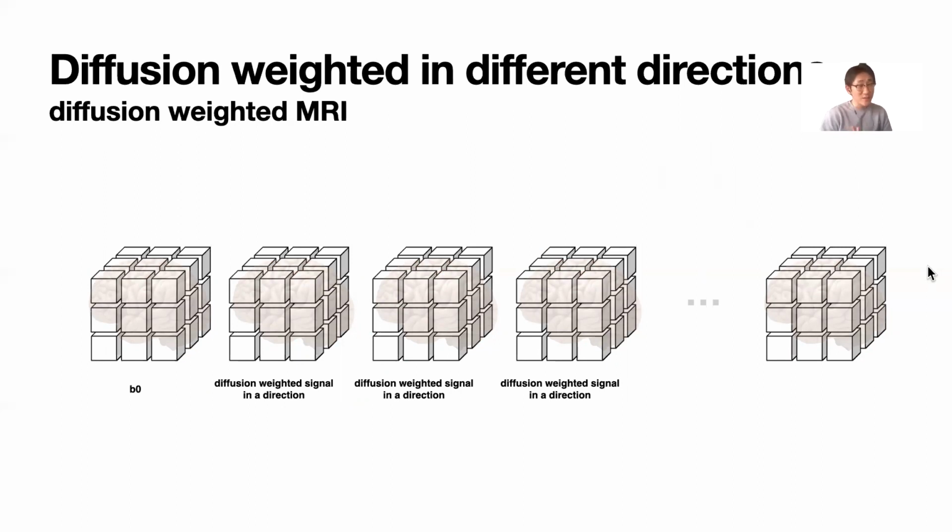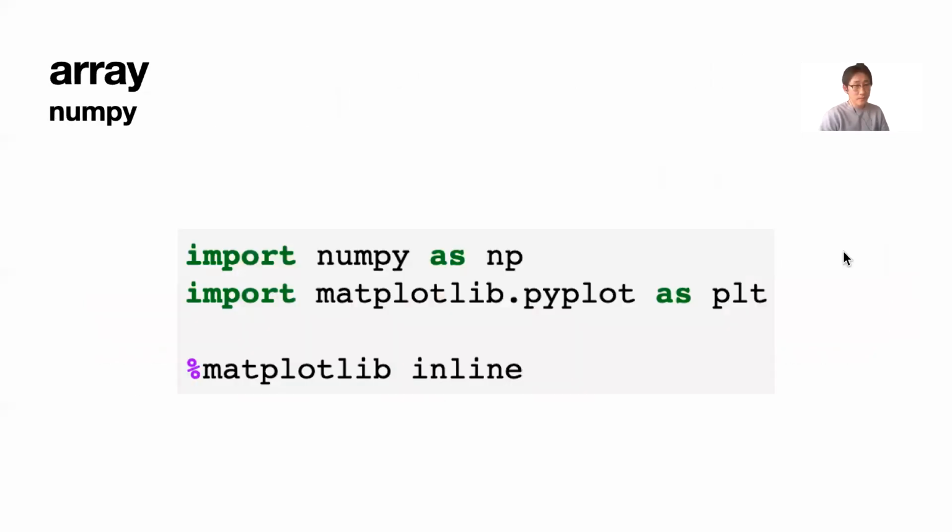To be honest, it took me a while to understand this simple concept. When I saw a brain image, I thought it was the output of some very difficult super science, graphs or something. But they are a simple array, simple numbers arranged in an array. Okay. So that's why we are focusing on arrays today. Playing around with small arrays can help you learn how to manipulate arrays, therefore how to use them, how to load your images and apply other tools to them.